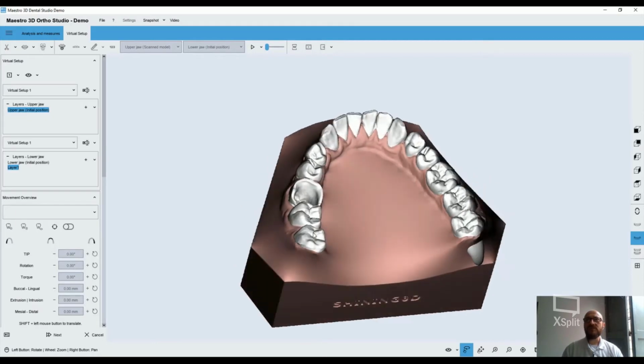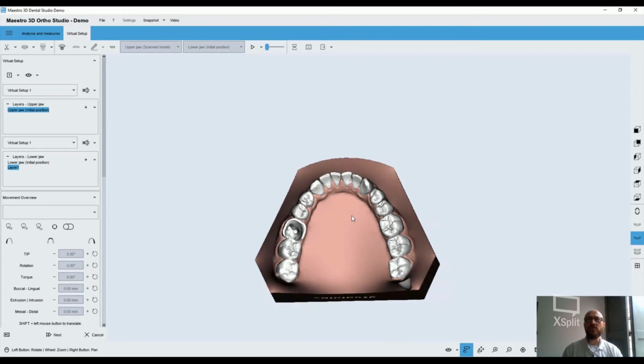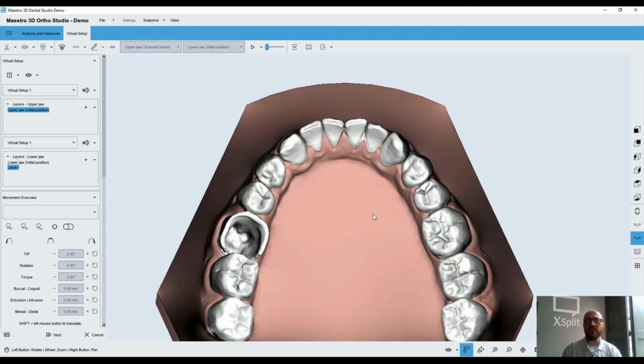First of all I have to highlight the elements that will be imported, double click with the left mouse button, and if I want to work on just one element, I can do it manually by pressing the shift keyboard button and the left mouse button.